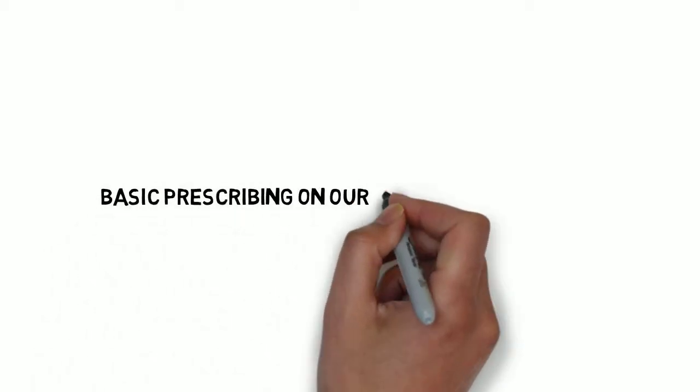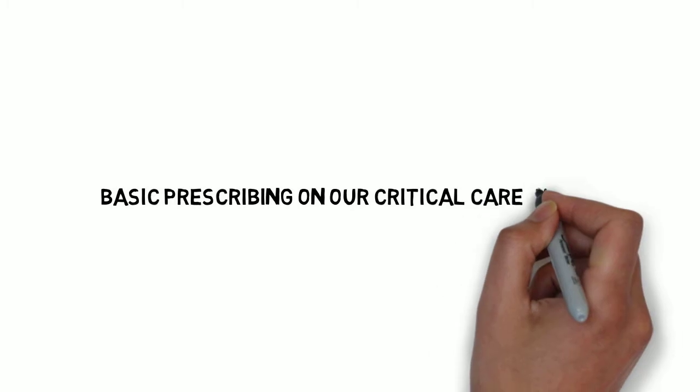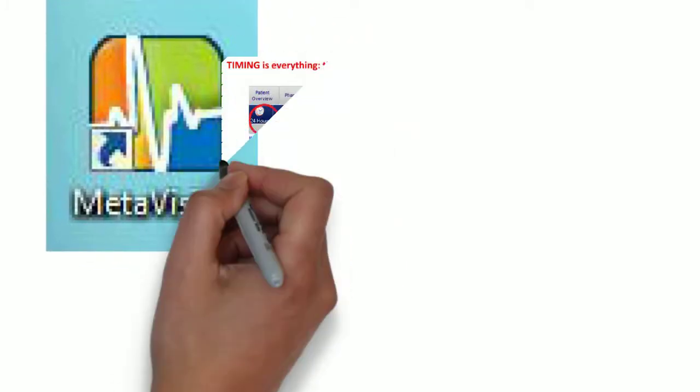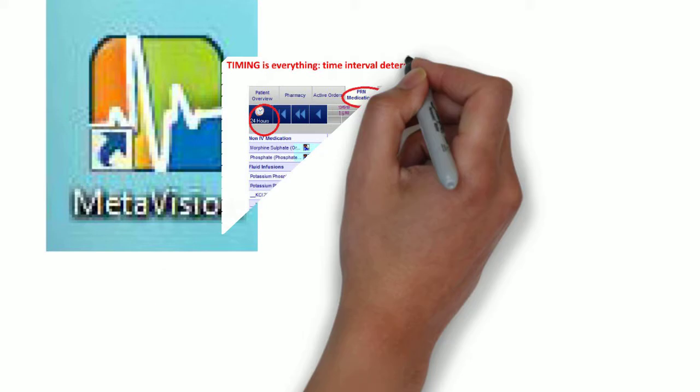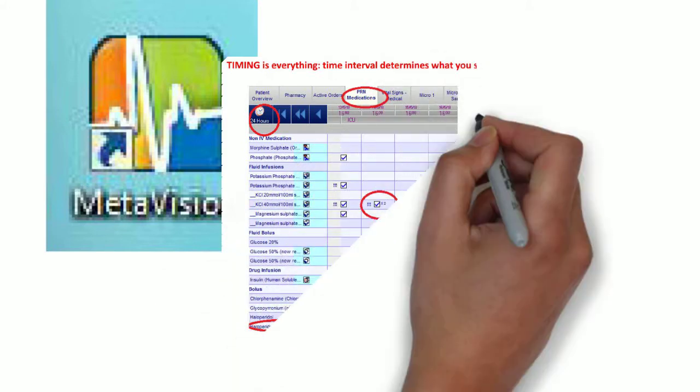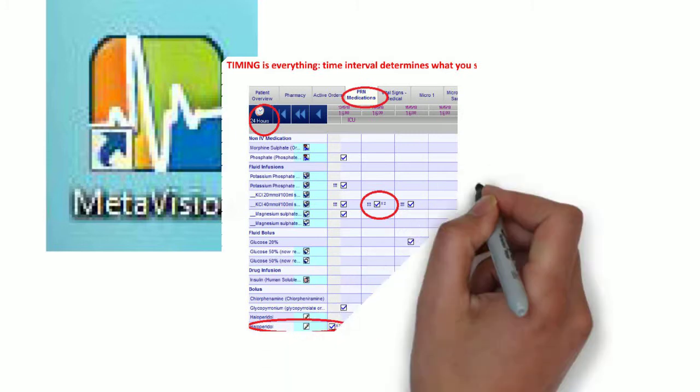This is an overview of the basic prescribing concepts in our critical care system using the CIS MetaVision software. You'll find the icon on your desktop. The most important thing to understand with the system is that timing is everything with respect to viewing the data and making sense of it.